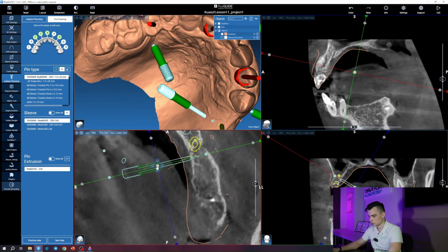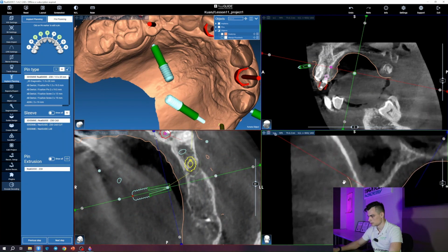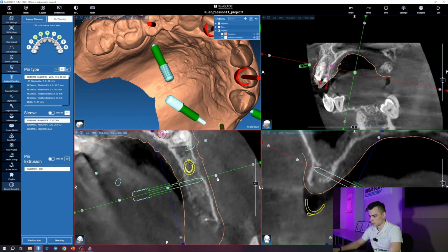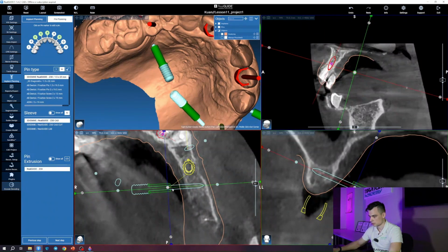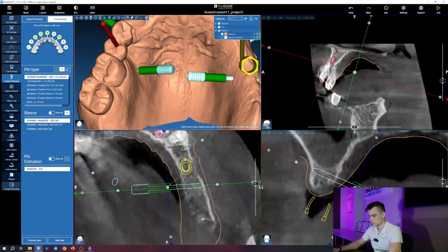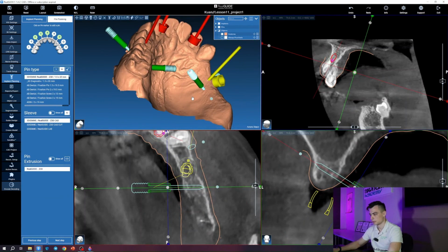So there's basically no bone here at all. That's not good. Although actually, yes, this is a good spot. We've found some kind of bone island. That's very good. All right, let's check everything again. You can set them at slightly different angles just to make drilling more convenient.